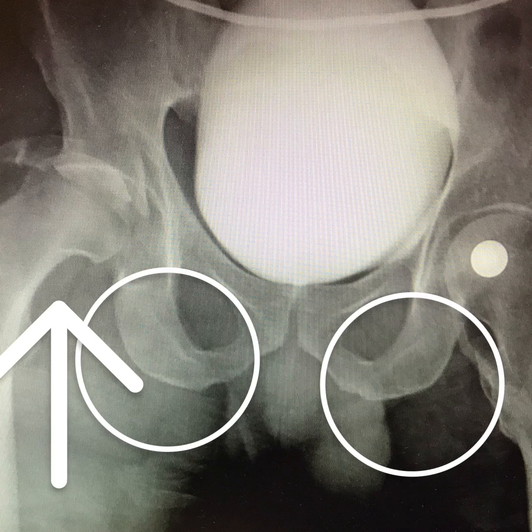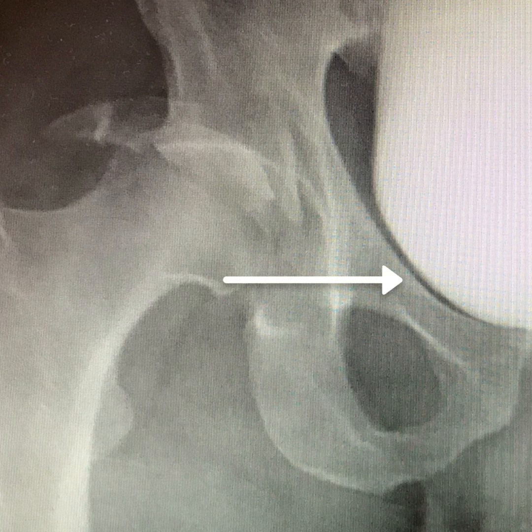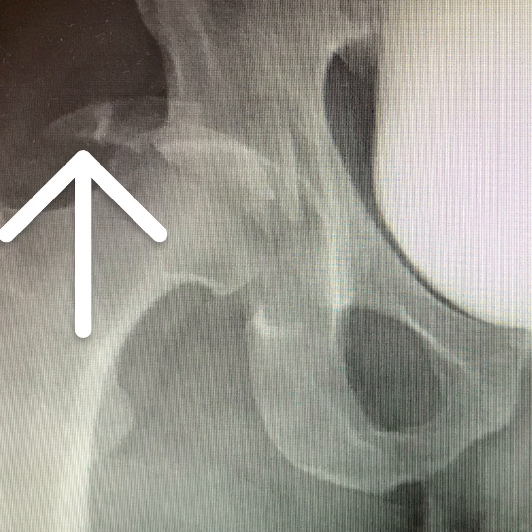On the right, it looks like the bottom of the femoral neck does not line up with Shenton's line, indicating that this is probably dislocated. Looking more closely at the right hip, you can see that the iliopectineal line looks intact. Ilioischial line also looks pretty good. Harder to see here, but the anterior wall looks intact, but the posterior wall does not.